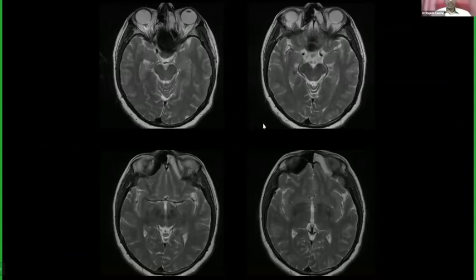Can you show? In the second image, yes, that is the region. If you go down to the previous slice, the first slice, that will be the sella with the pituitary gland. So in axial sections it looks difficult to say, but whatever information you can get, you can explain.